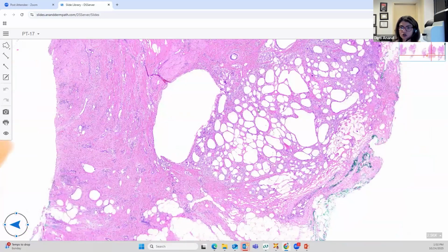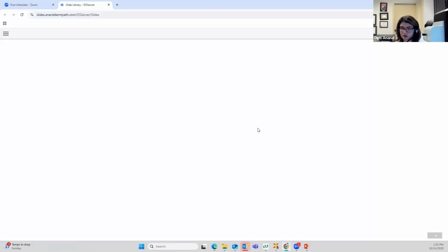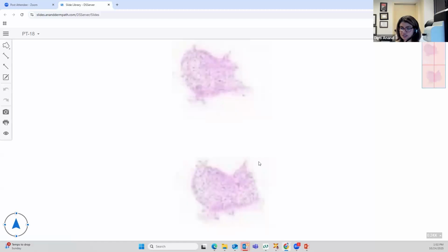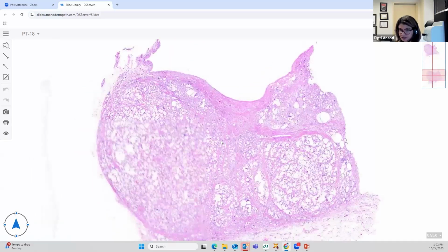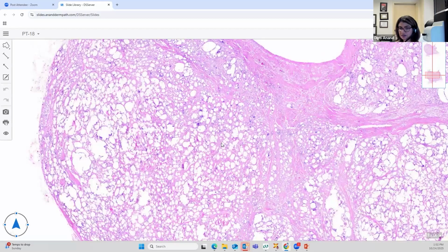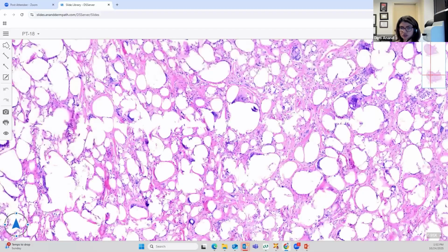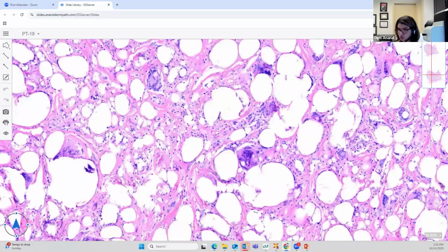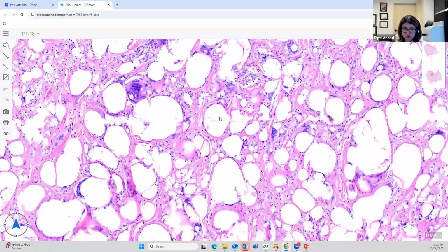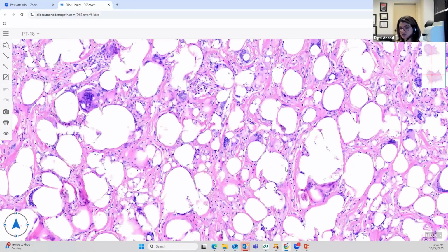Traumatic paniculitis can also be induced by something being injected, right? So that brings you into a silicone granuloma. We talked about the silicone granuloma when we talked about granulomatous diseases as well. The classic silicone granuloma is a Swiss cheese pattern. It's a pseudopaniculitis because what you get in here, which looks like fat, are actually fat-like droplets, which are associated with this inflammatory giant cell reaction. So it produces your very Swiss cheese appearance with these variably sized fat-like droplets, which all contain this non-polarizable material, which is silicone.